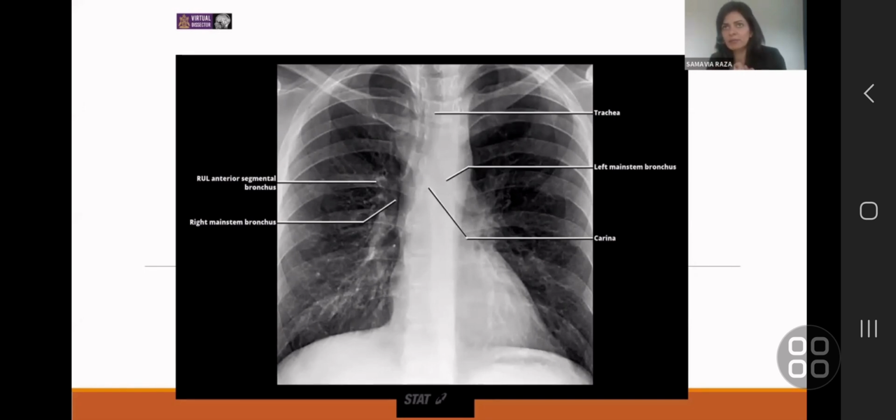So when somebody has a big trachea, or you noticed, I think it's big, and you measure it and it's slightly, 1 or 2 millimeter over what you have googled on Radiopaedia is normal, you have to think, why is there pathology to explain it?